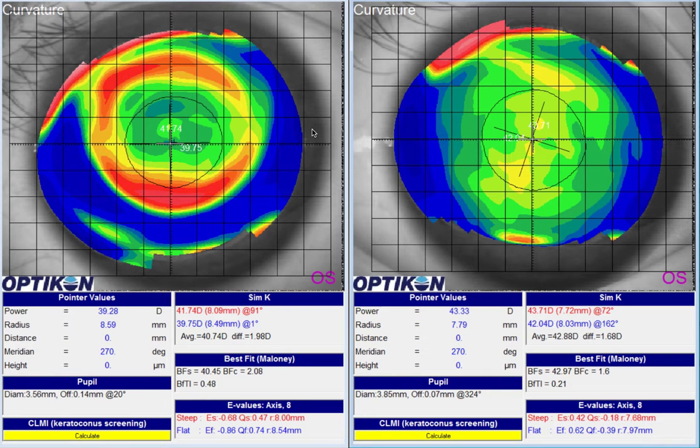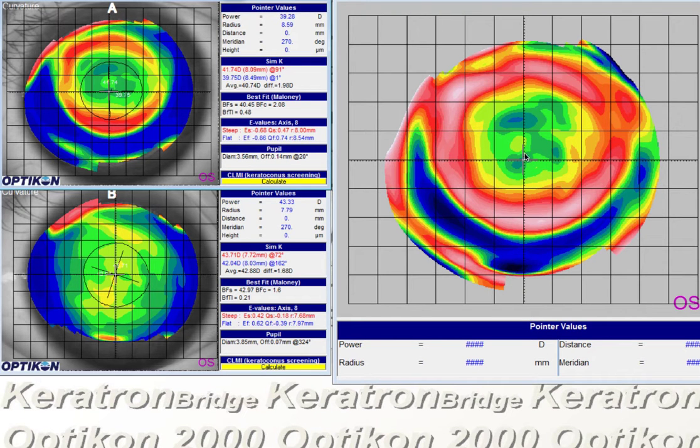In this orthokeratology case, we have a patient who is a little bit undercorrected and has some residual astigmatism after lens wear. We look at the post-wear and pre and baseline topographies. I'm going to pull up a difference map. We can see we're just not getting very even central flattening, and there's an area around the apex where it's almost no treatment at all.